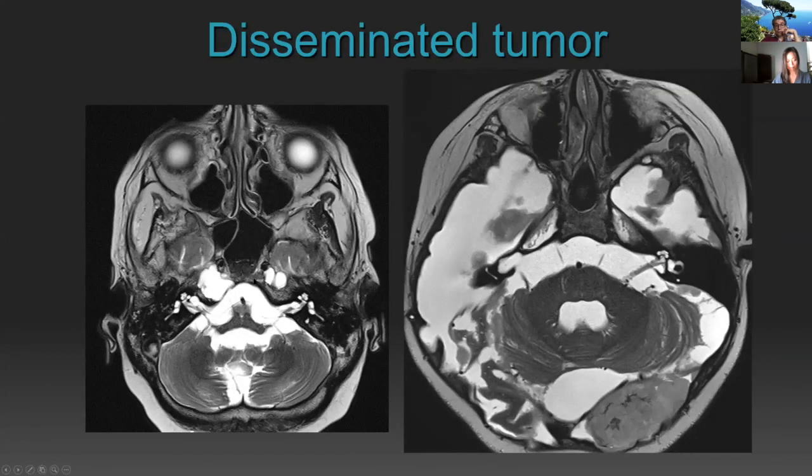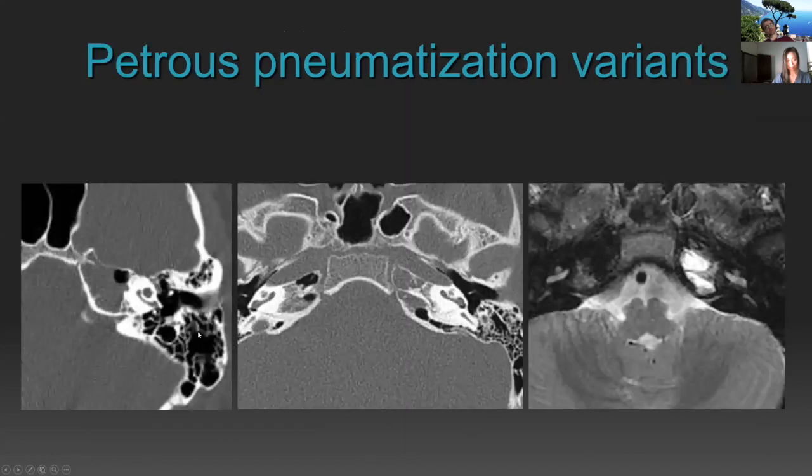And then we see bilateral cephaloceles and widening of skull-based foramina in response to chronic raised intracranial pressure, particularly in the setting of disseminated tumor, as in this patient who had a disseminated histiocytic tumor, when not only is there raised intracranial pressure, but there is also a CSF resorptive problem as well.